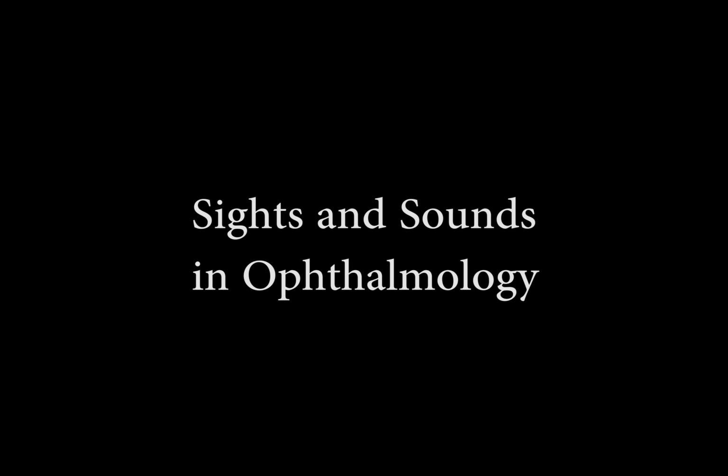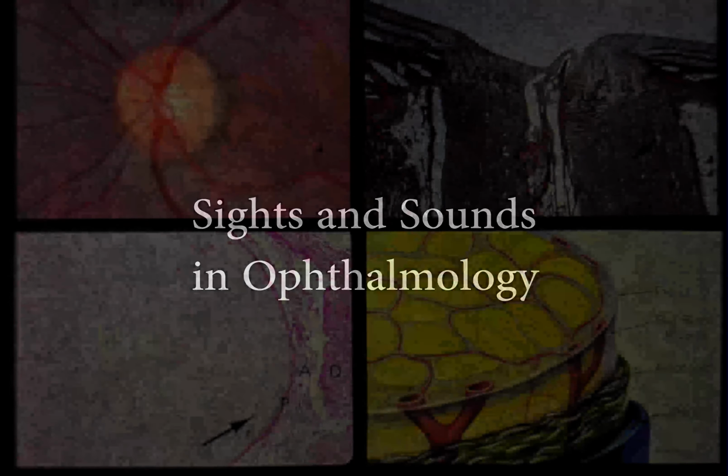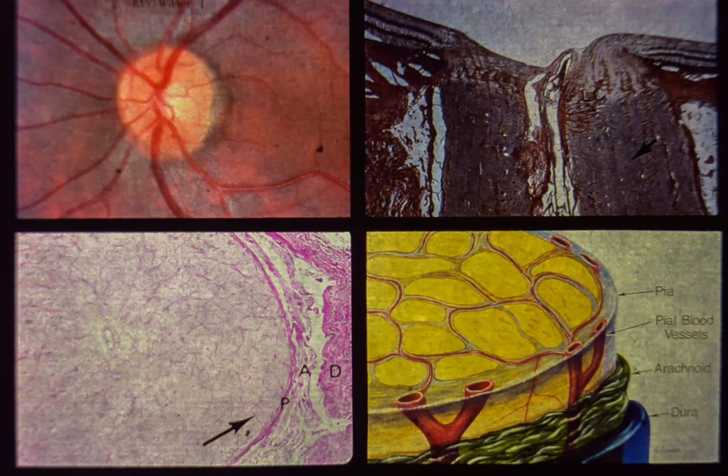Introduction. We begin with a detailed study of the ophthalmoscopic appearance and histologic architecture of the normal optic nerve. Slide 1. The normal optic nerve. Upper left. The normal optic disc is a well-defined, round, or vertically oval disc with a pinkish-yellow tint. The nasal portion of the disc may be slightly deeper in color than the temporal portion. The retinal vessels emerge from the center or just nasal to the center of the disc.